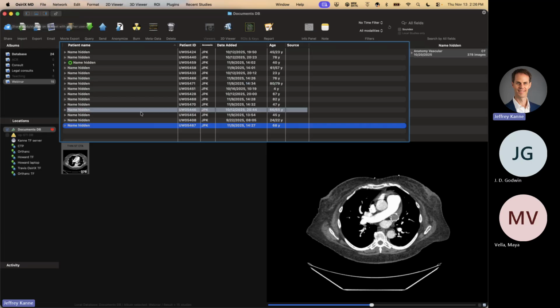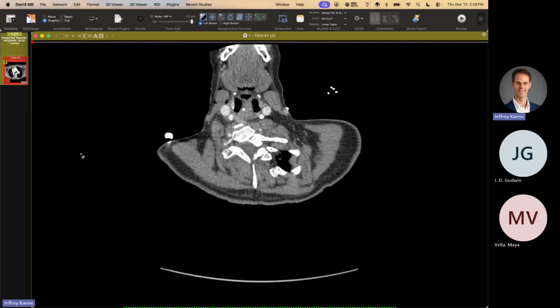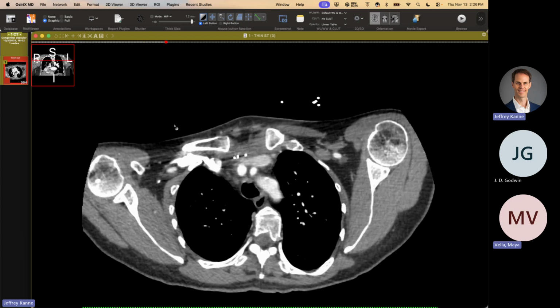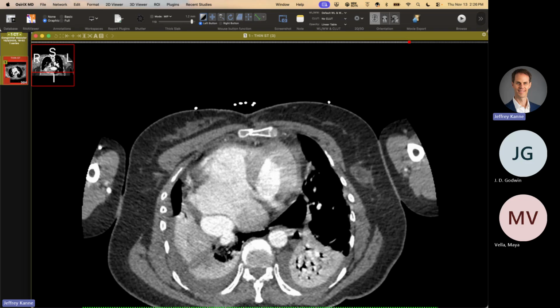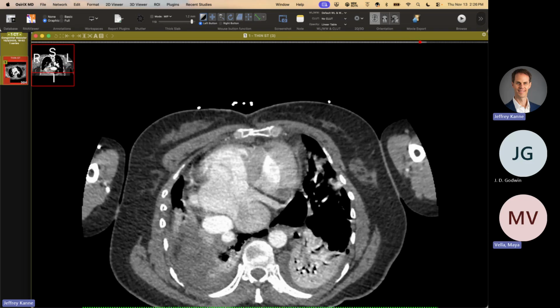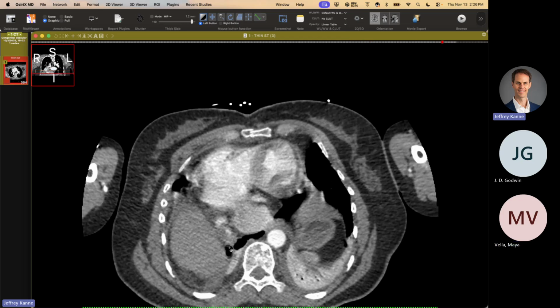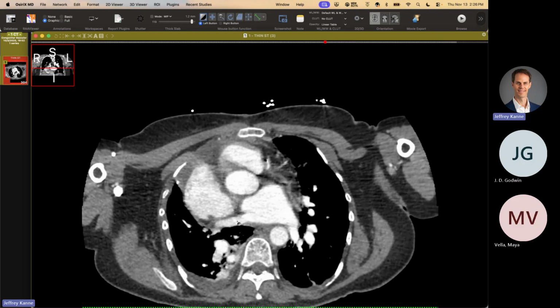And then this one, unfortunately, I don't have a pre-operative CT, but it still shows what I want to show. So this is a patient that had a big shunt, and there's this vein right here that drains the right lung that now is connected to the IVC. I'm sorry, coming in here. So this is coming into the left atrium. So this is a repaired scimitar.